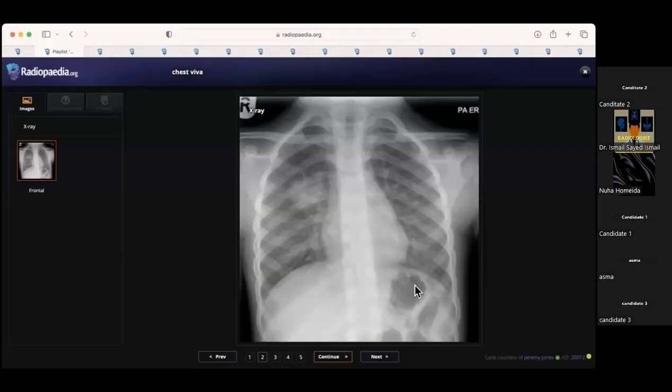Frontal chest radiography of a skeletally immature individual who presented with cough, where I can see there is a right upper lung zone opacity. It's not silhouetting the right cardiac border. I'm checking if there are any other associated abnormalities, but the left lung field is clear, no pleural effusion, no pneumothorax or pneumomediastinum. Heart and mediastinum appear within normal limits.